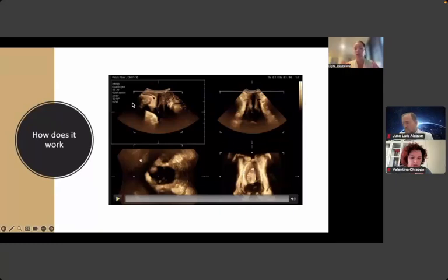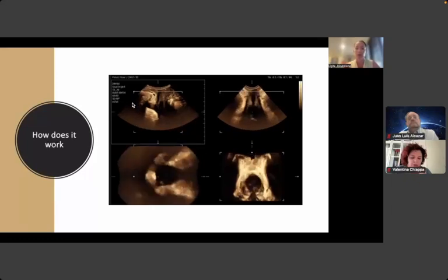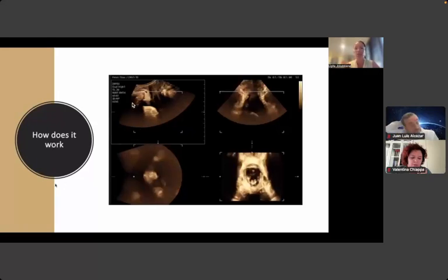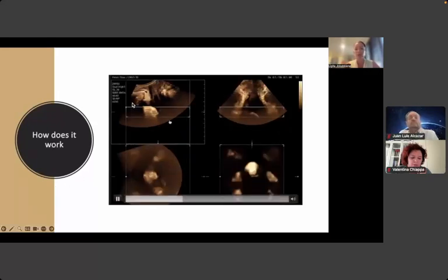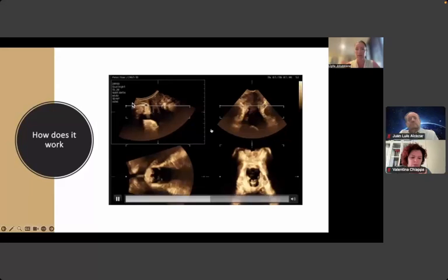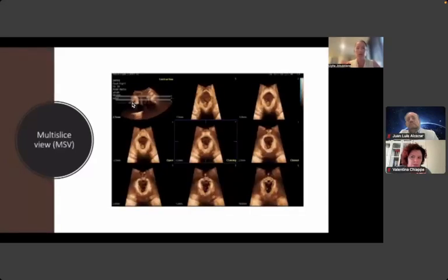So what we need to do is move the line. We can do it manually. So we activate and move the image around in order to place the line. We have to rotate the image a little bit. We see that the line is still not appropriate, but almost. Then, of course, we can reduce the rendering box and put it at the appropriate level. And in that case, we get the coronal view of the pelvic floor, which we can further assess. So again, we can do it either automatically or manually.